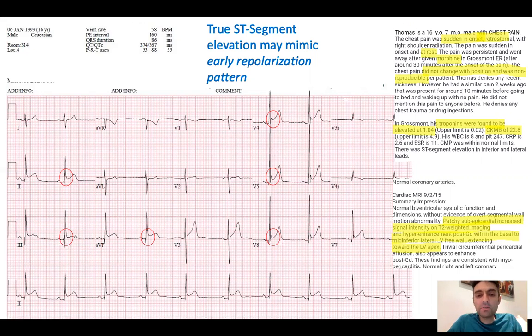However, if the patient tells you I have an acute chest pain, it's very severe, sudden onset, feel free to do troponins because no one would criticize you if you were worried enough to check for myocarditis. And there's PR depression, like what Ismail was saying. Again, PR depression may suggest pericarditis or perimyocarditis.